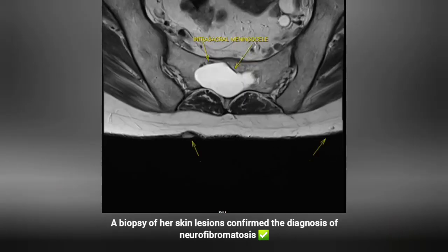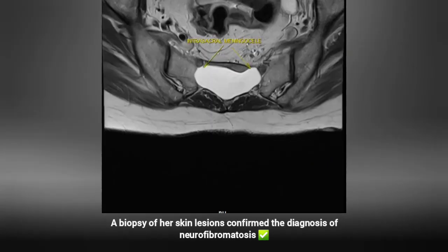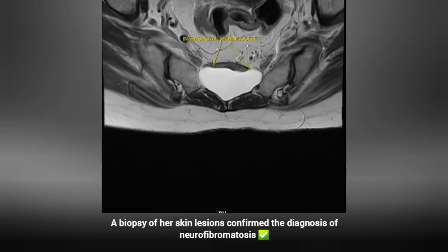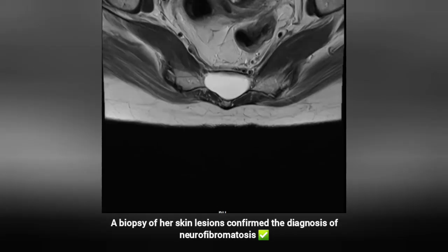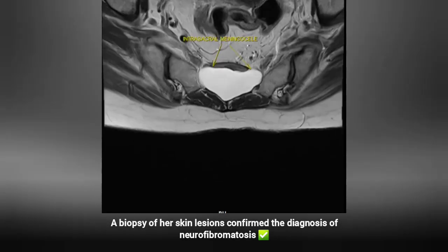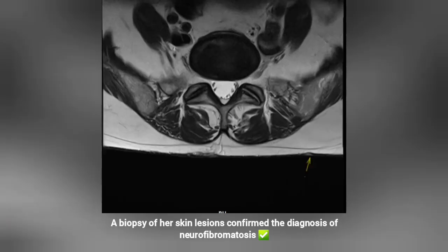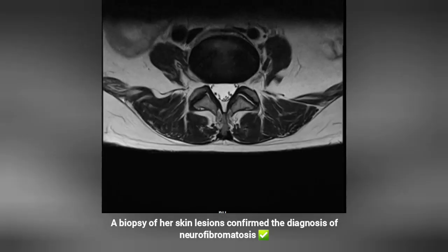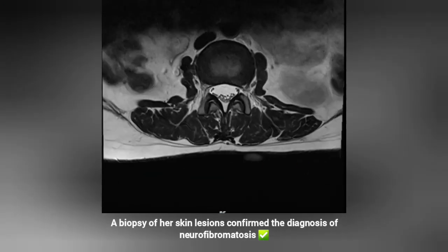The most frequent spinal findings include Dural Ectasia, posterior vertebral scalloping, lateral or central meningoceles, foraminal widening, scoliosis, vertebral dysplasias. In this patient, the large sacculation observed in the sacral region may have developed as a result of dural weakness and chronic CSF pressure associated with NF1. Bone remodeling occurs secondary to dural ectasia, and over time, prominent scalloping develops.